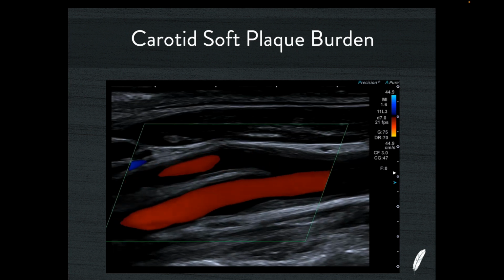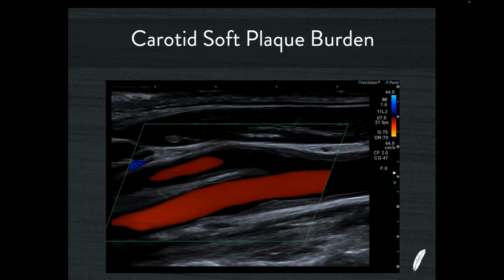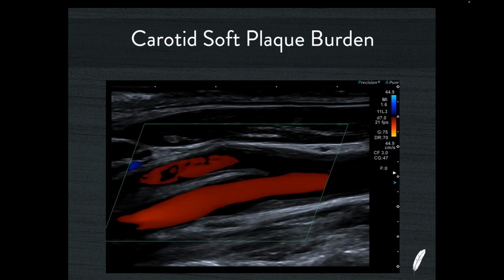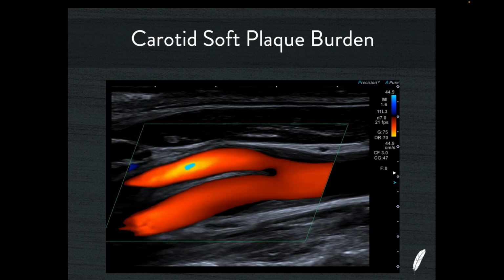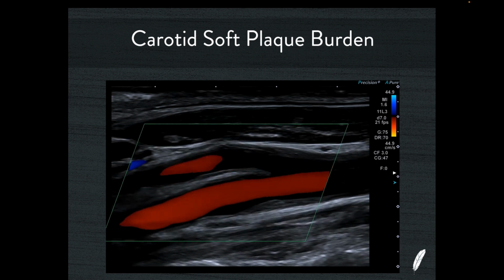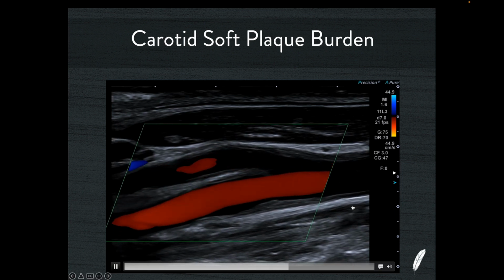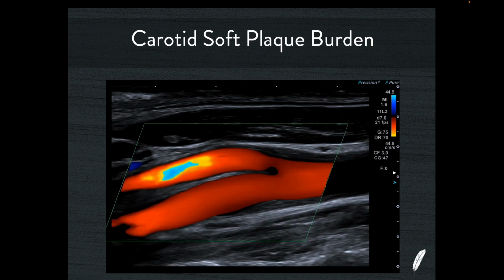But if I see this appearance in a 25-year-old or even a 30-year-old, I might then start to question whether or not their vascular health is as good as it needs to be. Because this bit of early plaque formation might be the tip of the iceberg. It might be a first indication that we have an arteriopathic patient. And if we think about the work that was done with intima media thicknesses, this was really, if you like, along the same lines of thinking.